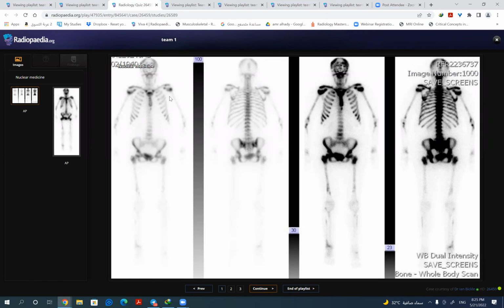And in the second set of images, I can see there is some uptake in the distal tibia on the right side, and also in the distal femora, and I can see there is uptake within the calvaria as well, the bony calvarium, and some differential uptake within the soft tissues. I'm not so sure. You just ignore that suspicion. So what is your conclusion?